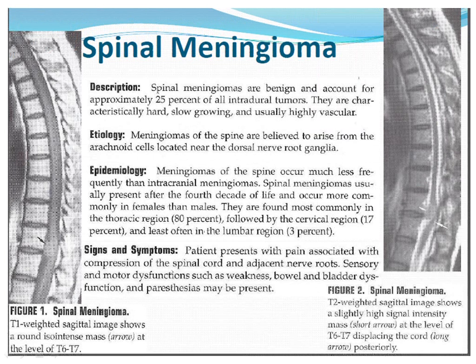This is another spinal tumor, a spinal meningioma. Meningiomas are pretty common benign tumors. They're quite a bit more common in the brain, but they're fairly common in the spine as well. They cause a little bit more trouble in the spinal canal because there's a lot less room for them to grow, whereas sometimes brain meningiomas can grow very slowly over time and not cause any symptoms.